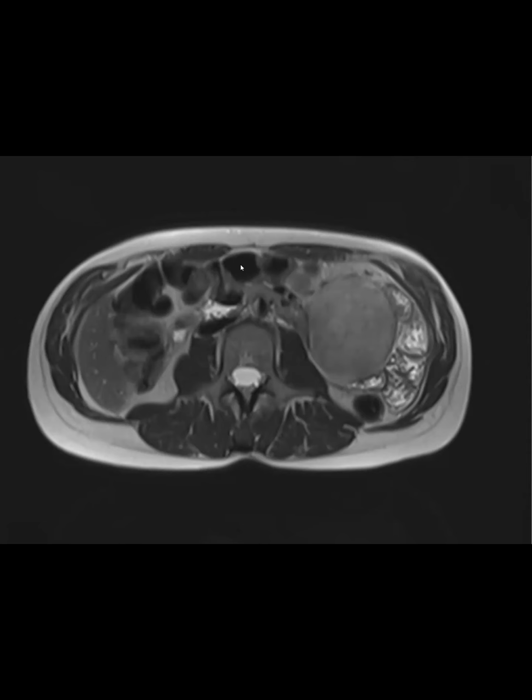And they can either be T2 bright if they're more cellular, or T2 dark if they have more collagen. So don't exclude a desmoid if you think, oh, this is too bright for a desmoid. They're supposed to be fibromatosis, it's supposed to be dark. They can be one or the other. And it doesn't necessarily even go with which ones are well circumscribed or infiltrative. It goes with what the underlying pathology is.